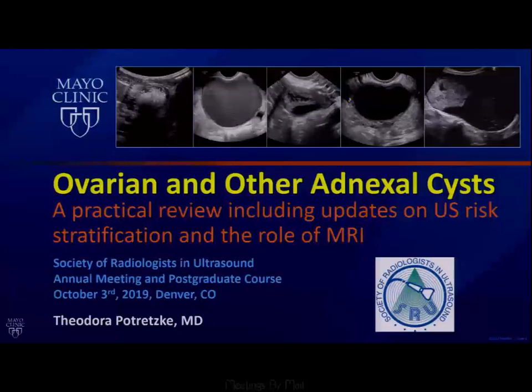We're going to talk about ovarian and other adnexal cysts. And keeping also with the goal of bringing in other modalities to this Thursday general session, I hope to update you and review a little bit the role of MRI in the evaluation of cystic lesions in the adnexa.